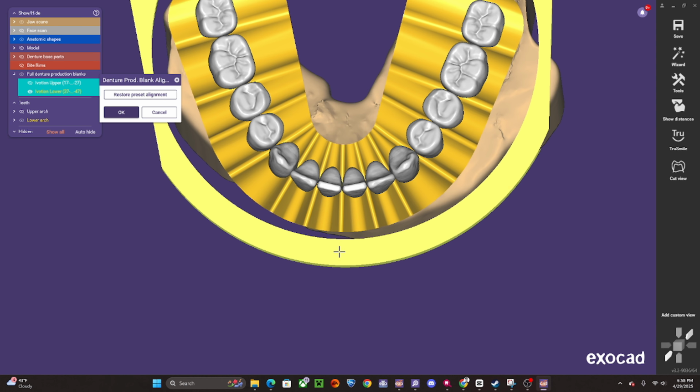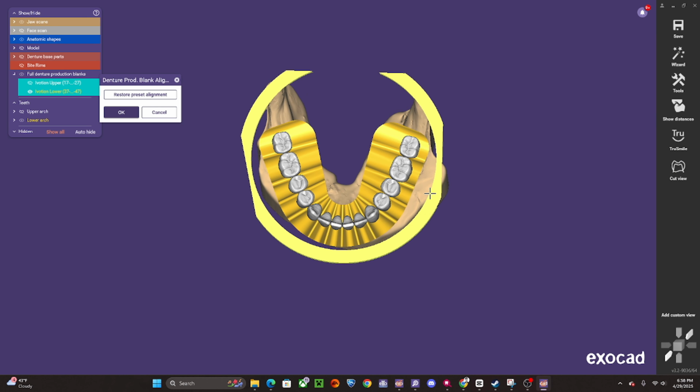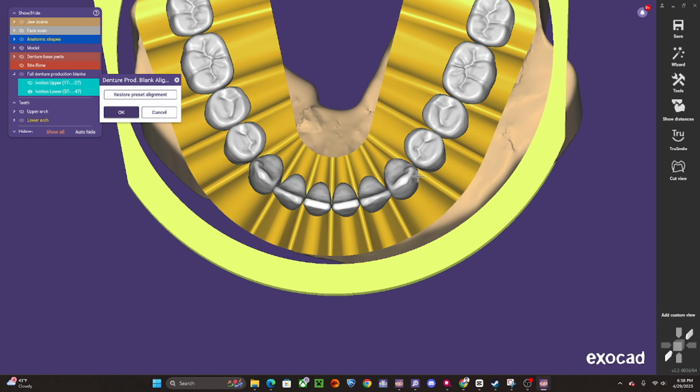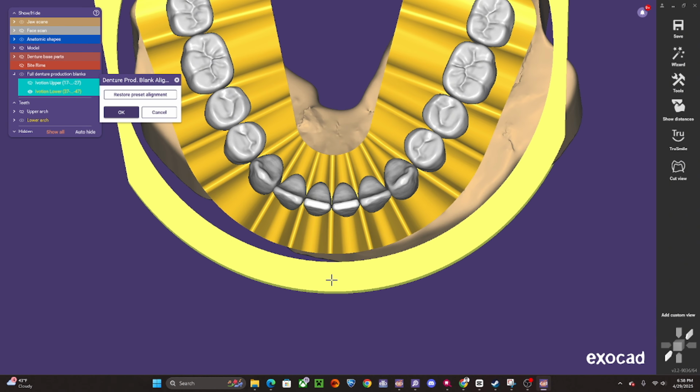So I always look at it from the occlusal view, and I try and look directly down the puck so I can't see any edges or borders of the rest of the puck. And what this was is the distal was hanging over. So I'm going to take this and pull this whole ribbon bilaterally lingual. One motion lingual.